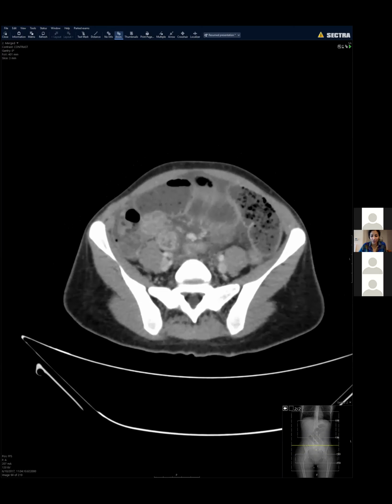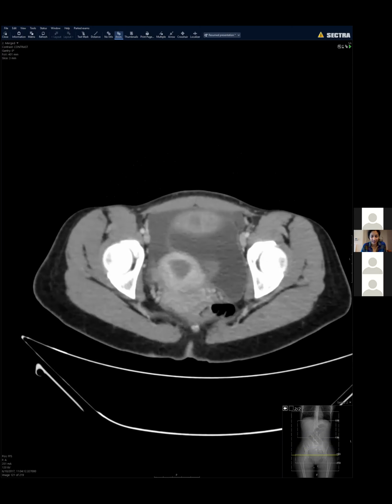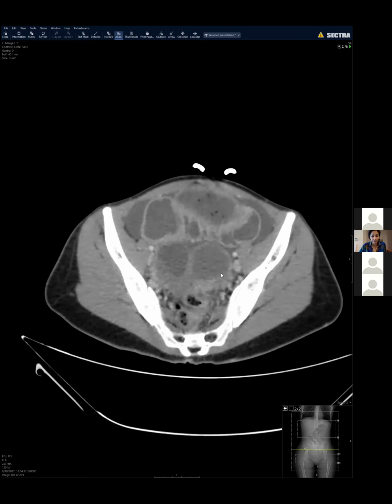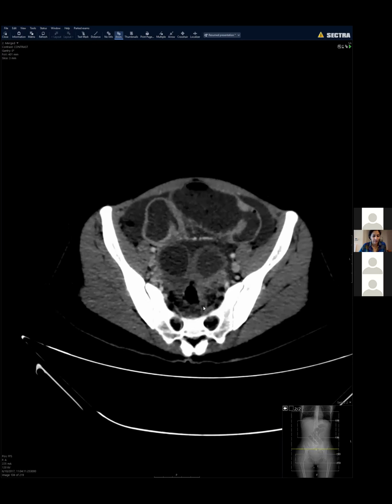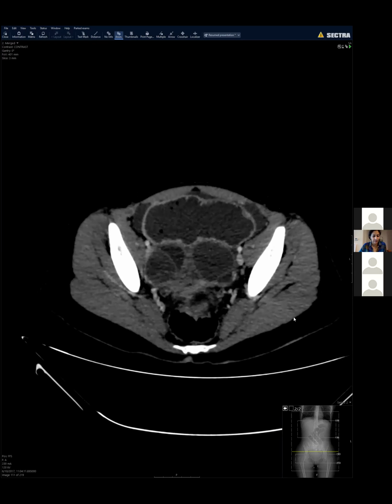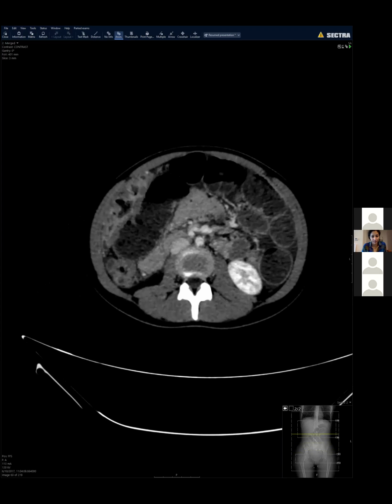Looks like the ovaries are abnormal. Okay. Rightly said. So the endometrium had some fluid, and then both adnexae had these multilobulated cystic structures. And when we looked carefully at this left one, it almost looked like some of them were septations, almost like a tube. And when you change the windows to a narrow window setting, some of these had more complex contents than just simple fluid, and they were in the 25 to 30 HU range. So young female, she could have hemorrhagic cysts, other bilateral ovarian lesions of some sort.